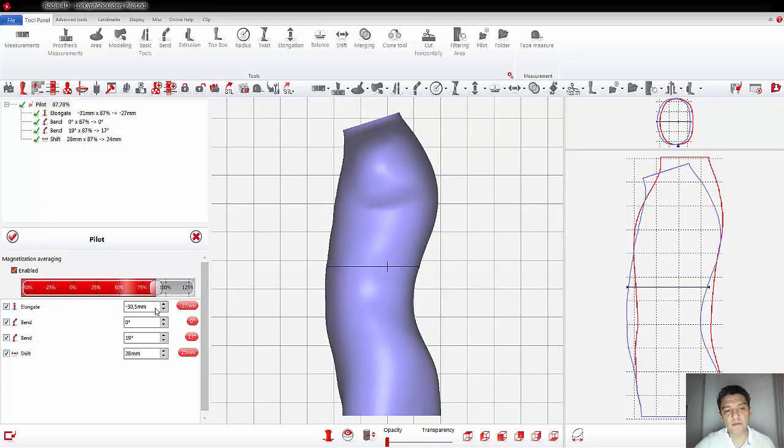There are people that develop their own template with all the steps, and after you will see in other webinars, when you have your template, you open your template, you insert the scan, you merge, and after you start to apply all the lines that you have saved in your historical window. So there are many possibilities, many ideas, and again, we are here, we want to help you.